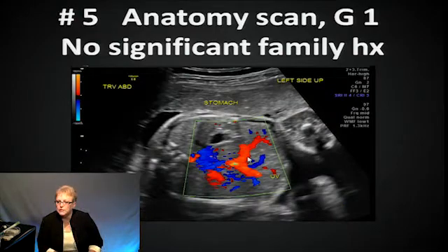The question was if we saw this patient in the first trimester, would we see these tumors? Usually we wouldn't see them at this time. This is one of those things that as the baby grows, as the heart gets bigger, we can see them from about 20 weeks on up. So you can have a normal early scan and have this show up later.